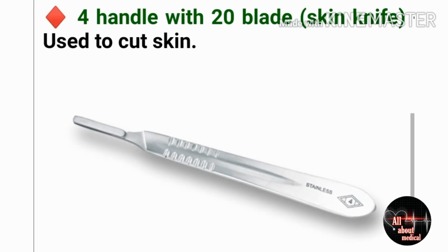And this is the number 4 handle with 20 blade. It means a number 20 blade will fit in this handle. And here also number 4 is written on the handle. You can see very clearly it is a skin knife and used to cut skin.